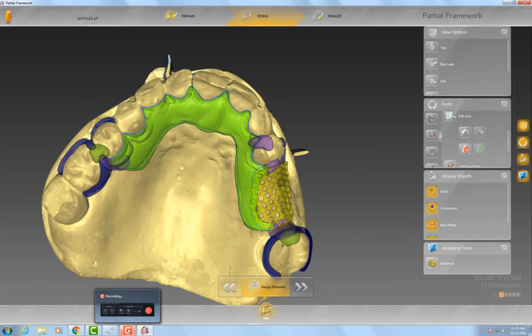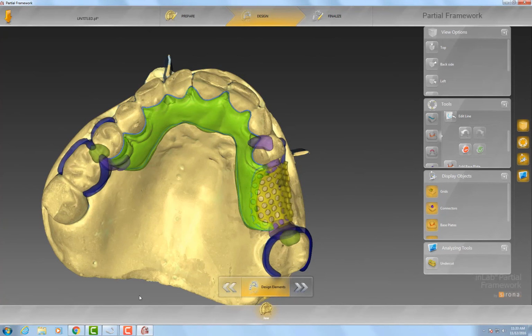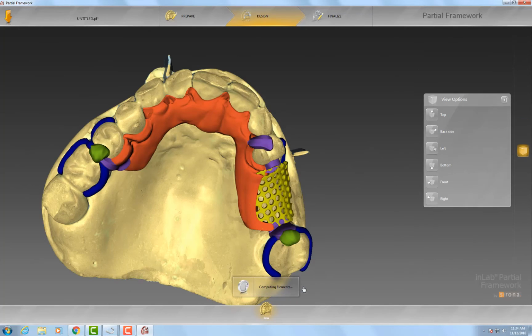So, sorry about that. This is kind of newer software to me. So then once you have all your areas designed, you go ahead and hit finalize, and it's going to group everything together. But you are now ahead of the game because you've waxed everything up in less than 10-15 minutes. These are great materials where you can go straight into manufacturing. There's no warping, there's no wax, there's none of that stuff that just kind of makes it, I don't know, labor intense. I'm not a big fan of doing it the traditional way.